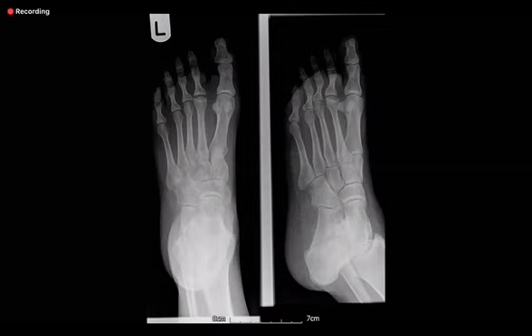This is a classical Viva scenario: once talar beaking is there and the examiner shows you an oblique view, if there was calcaneonavicular coalition, it would have projected here and you would have seen it. So oblique view for calcaneonavicular coalition, but for talocalcaneal coalition, ask for an axial view. That is a classical Viva scenario.